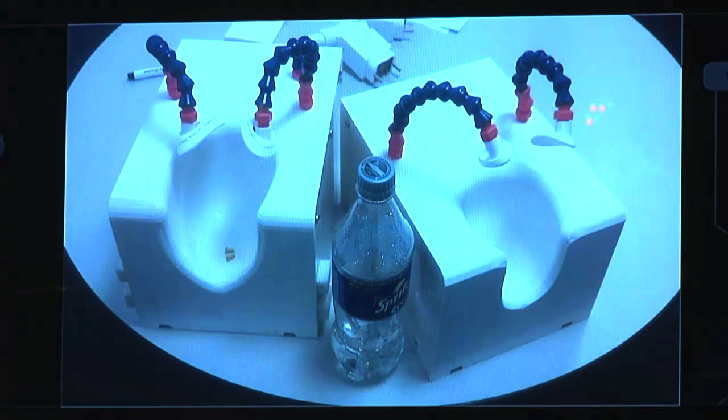So, what I wanted to say, the fetal neonatal of our lab, fetal neonatal neuroimaging and developmental science center means like babies inside, unborns and toddlers, this age range. So here you see a different type of coil, which is very small actually. I put the Sprite bottle there to see the comparison, how small the kids are we can scan.